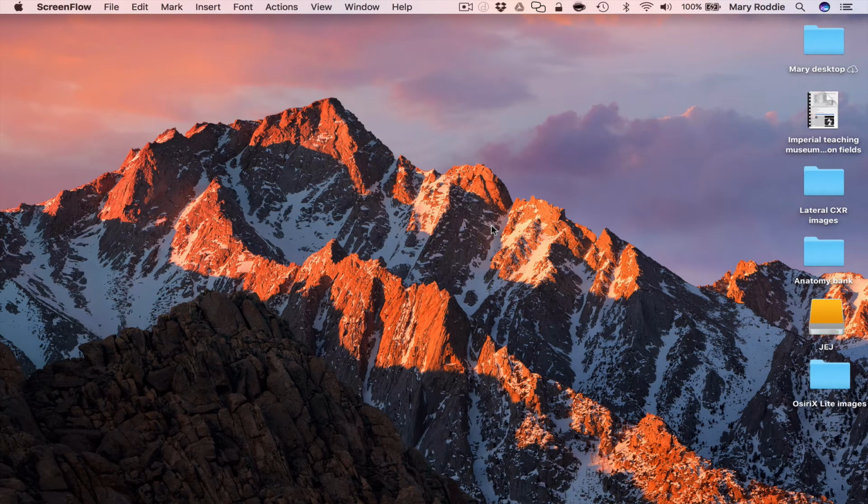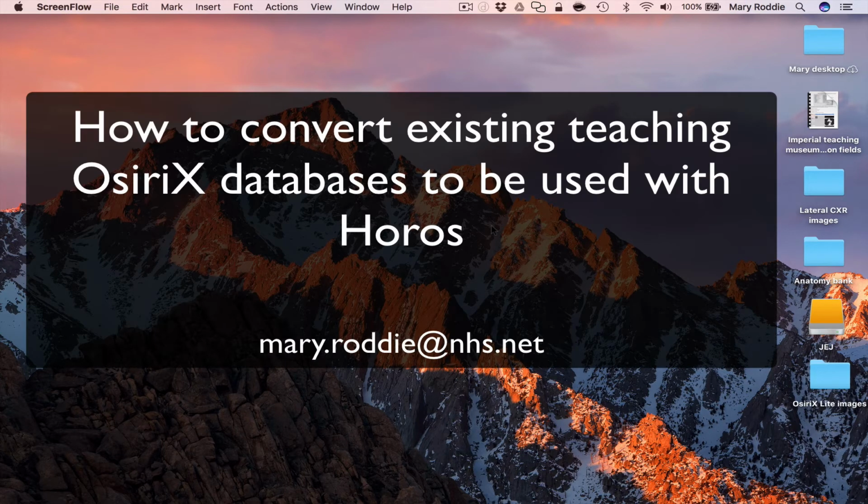So in summary, this video has explained how to transfer your existing OsiriX teaching databases into Horos so that you can get ready for all the FRCR preparation courses that are coming up and all the regular departmental teaching that I know everyone does. Thank you very much.